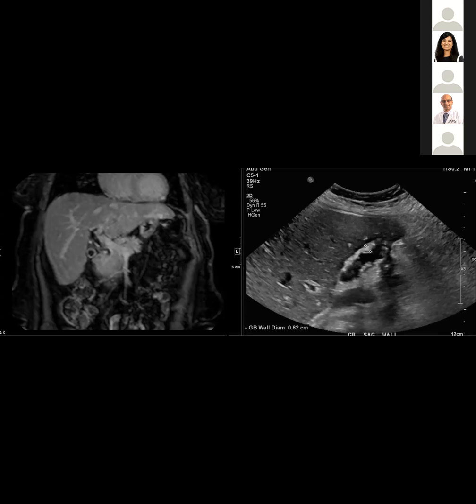So it's a gallbladder neoplasm, slam dunk. So I think differentiating tumefactive sludge, adherent non-calcified stones from gallbladder cancer is super easy by contrast-enhanced ultrasound because our sensitivity for blood flow is so exquisite that we're not having to equivocate on Hounsfield unit changes or subtraction images. So I implore you guys to consider contrast-enhanced ultrasound in these difficult cases.